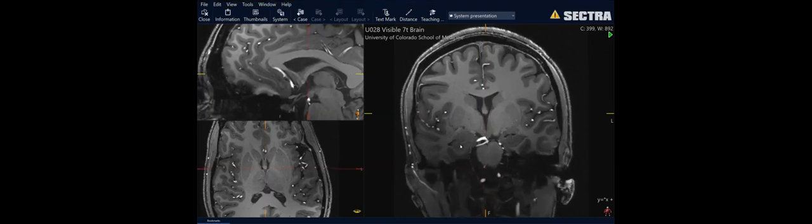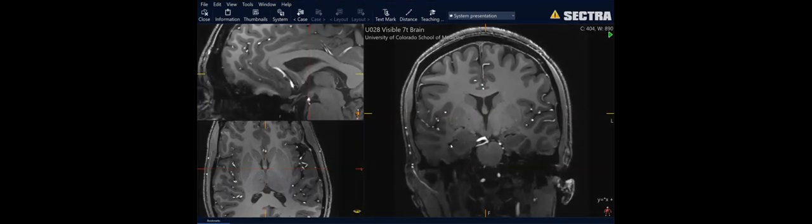And we're looking at this inferior horn of the lateral ventricle now. Let's dive into that. So we've got the inferior horn itself, located inferiorly, and medial to it, or in this instance a little bit lateral, is the hippocampus. But superior to it is the amygdala. So whenever we can find that inferior horn of the lateral ventricle, the hippocampus is going to be below it, the amygdala is going to be above it. I know that was a particular question we had.